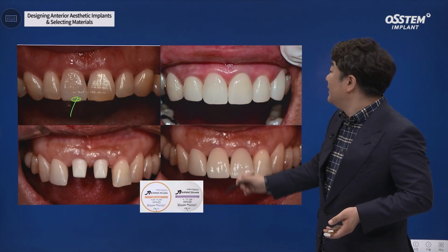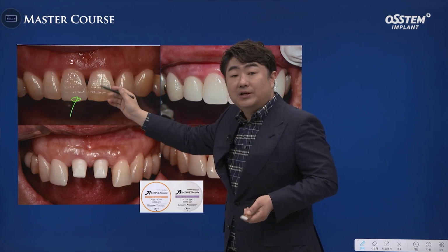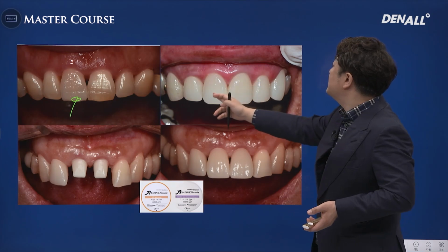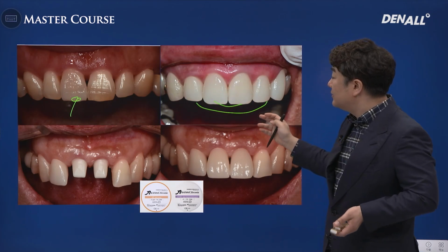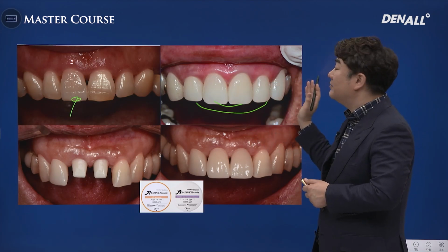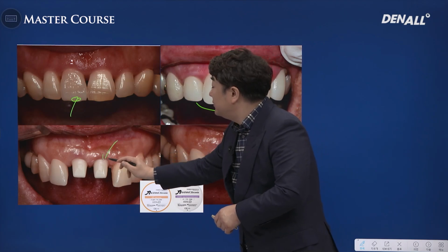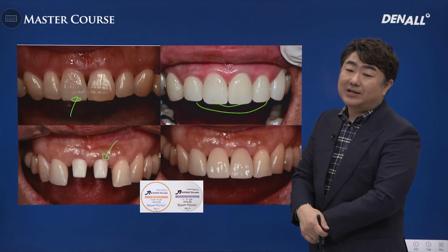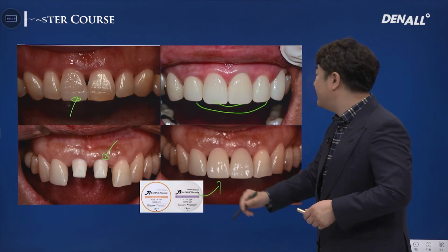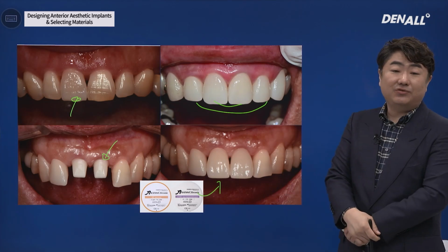In the case of a single crown, there's high aesthetic demand, so you can use a bit of porcelain. When multiple prostheses go in and they need to be in symmetry, monolithic zirconia can be used to get satisfactory results. Zirconia abutment: when fabricating, you need to use a block with about 1000 megapascals, and this one was about 750 megapascals, and it shows quite aesthetic results.